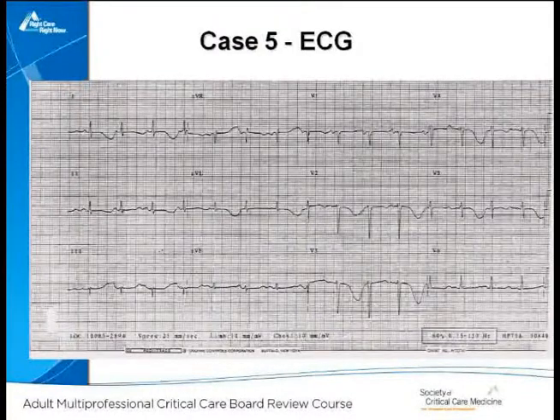So what are we seeing here? Well, this is T-wave alternans. So let's look at the rhythm. The rhythm is sinus rhythm. The QRS is relatively narrow. The dramatic thing is that we have QT interval prolongation with alternans in the amplitude of the T-wave. And that's a marker of a severe abnormality in repolarization.